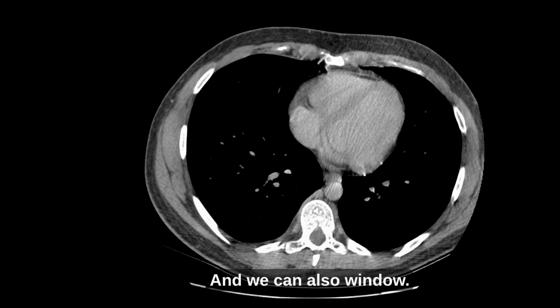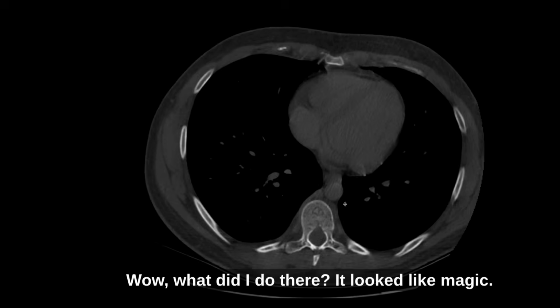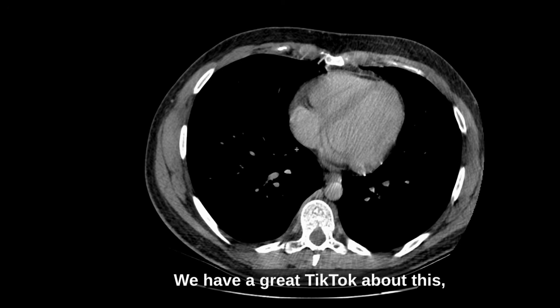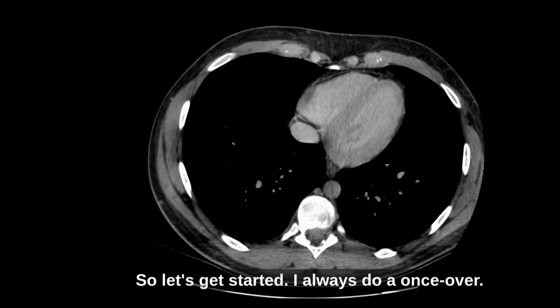And we can also window. Wow, what did I do there? It looked like magic. I go back. All I'm doing is changing my grayscale. We have a great TikTok about this, but we'll be looking at different windows throughout the study. So let's get started. I always do a once-over.